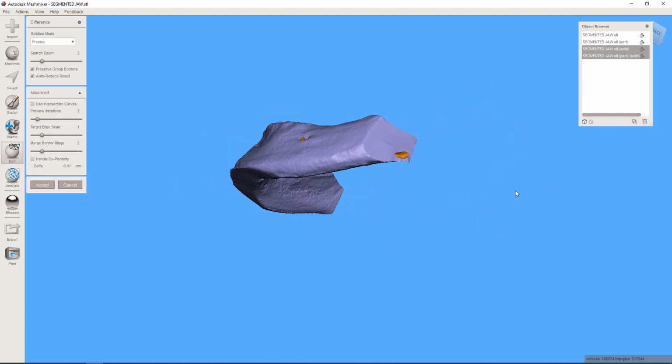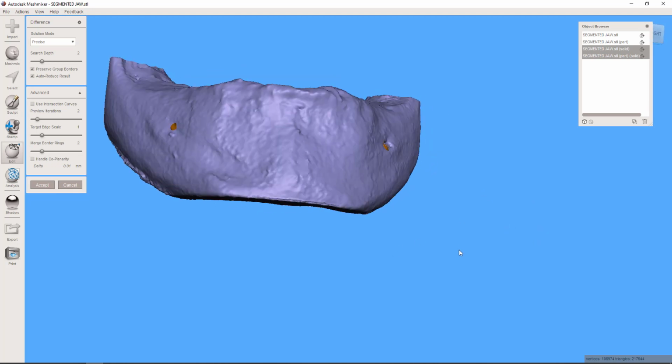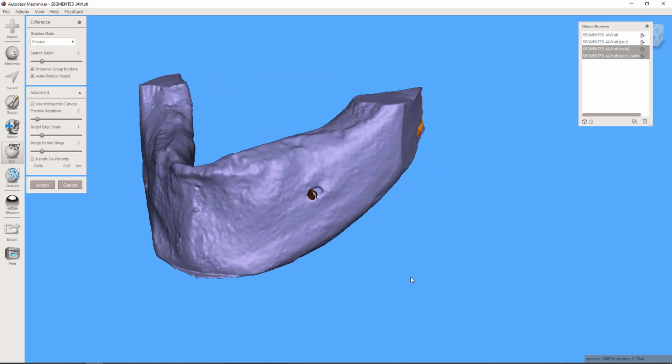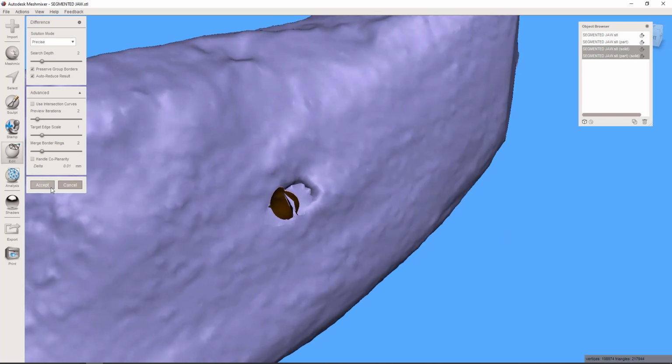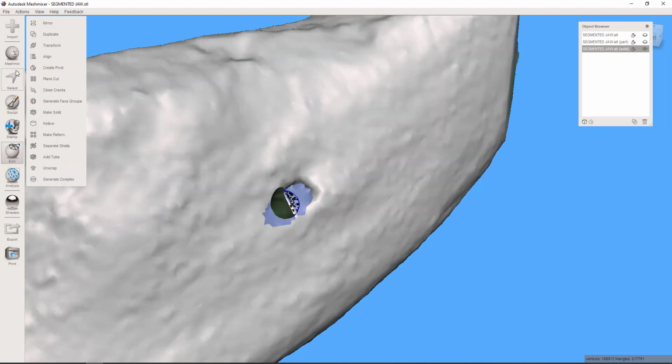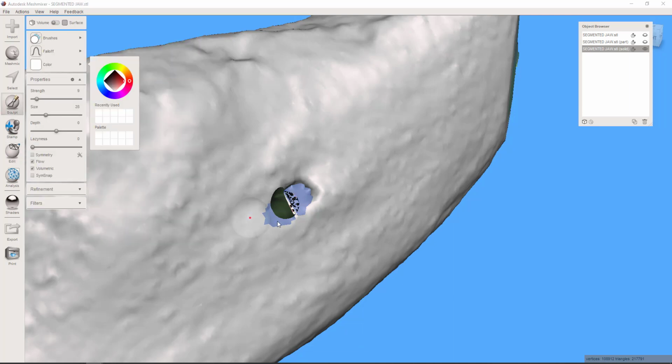This is the challenging part of Mesh Mixer, is you can't always just rely on one technique. I mean, some of those things are not intuitive whatsoever. I've just used this so much and run into so many problems that I've just kind of found ways to deal with them. And a lot of that just comes down to really understanding these 3D meshes.